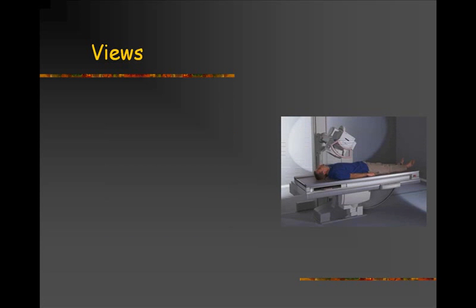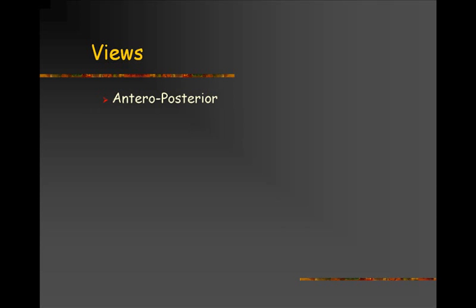The opposite of this might exist when the X-ray strikes the patient anteriorly and crosses through the patient and exits posteriorly, that is an antero-posterior or AP view. Thus we have an antero-posterior view when the striking X-ray is on the anterior side first. The opposite of this is a postero-anterior view.